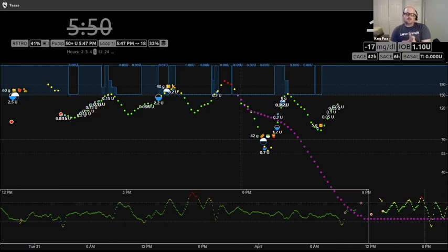I'm surprised how many people don't know you can do this, but this lets you scroll backwards and you'll see that these pills will change back to what they were at this moment in time, even the loop pill. So if you want to see what Loop was sending at this moment in time, you can look by hovering over the loop pill and see what's going on. The cool thing also with Loop is that the purple or pink prediction line moves too as you scroll backwards. So this is a really important learning tool for trying to understand what Loop is doing. Because remember, like Katie says, it's all about the prediction line as to why Loop's choosing to do what it's doing. So it's more useful to scroll backwards in Nightscout.